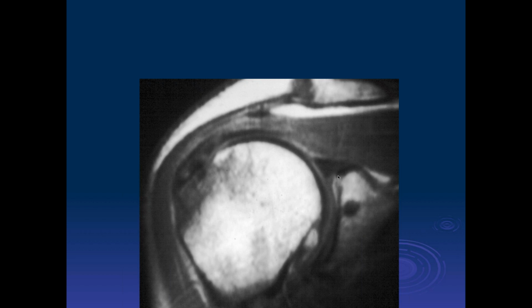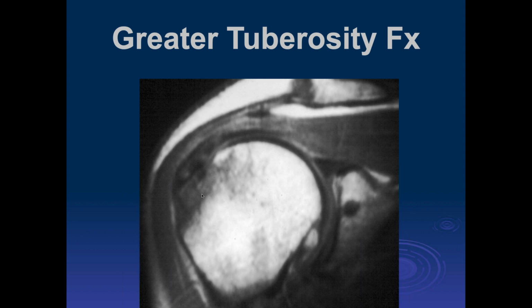Okay. Michael, what do you think of this case? Okay, so I assume this is a T1 coronal. There's low signal intensity in the lateral humeral head. It looks like there's either subchondral cyst or kind of erosive type change in the glenoid as well, and maybe that's either a little bony fragment or marginal osteophyte projecting off the inferior humeral head. This was a bone island here. Okay, so it's just a little sclerotic bone island.